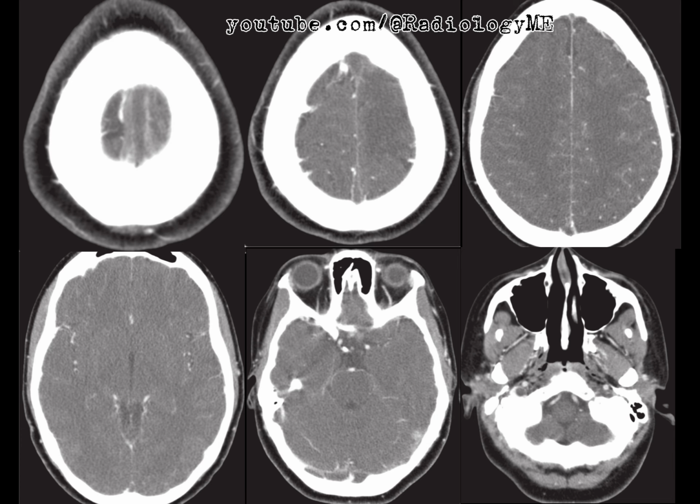It's essential to emphasize that the rest of the intracranial arterial system, seen in the available images, looks unremarkable, but we would always thoroughly review all available imaging, especially to exclude any arterial involvement. I would convey these findings to the referring clinician immediately, as this case would require urgent intervention, possibly involving anticoagulation therapy or further specialized care.